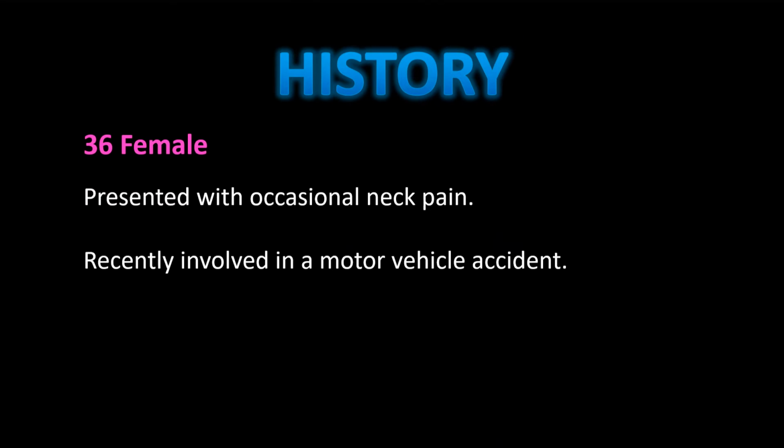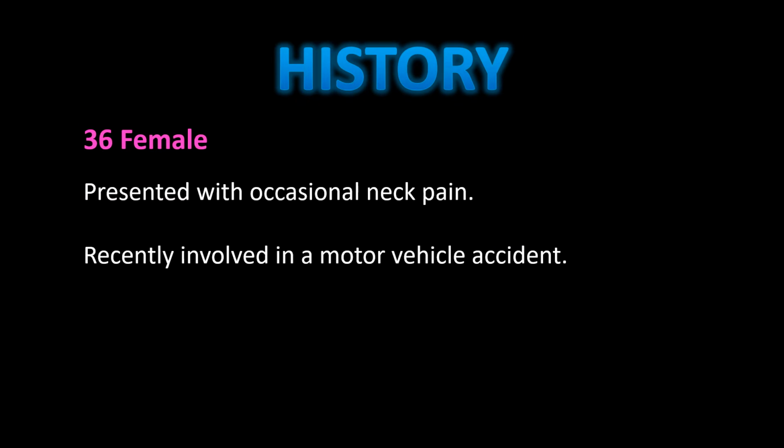Case number 4. A little history on this patient. This is a 36-year-old female who presented to the office with occasional neck pain. She was recently involved in a motor vehicle accident, and the treating doctor took x-rays to rule out any trauma or significant abnormality.